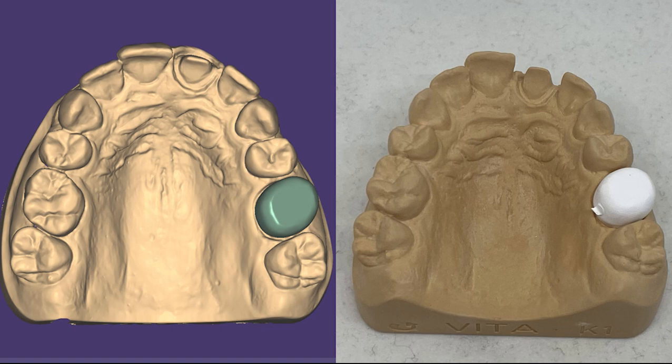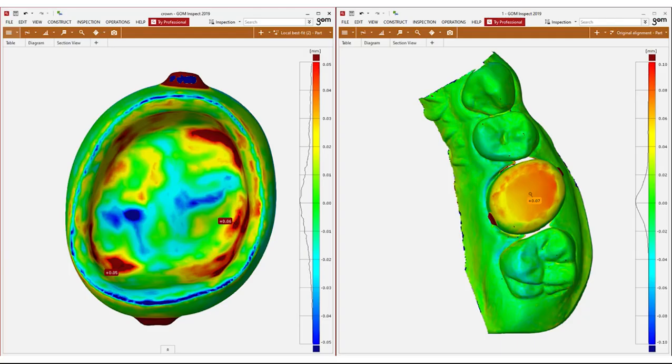On the right is a photo of the machined result adapted to the model. The right side was scanned and compared to the design file on the left. The fact that this is from an old lecture and did not use Medit software does not matter. Ways to verify the machining results with Medit software will be explained in the next lecture.